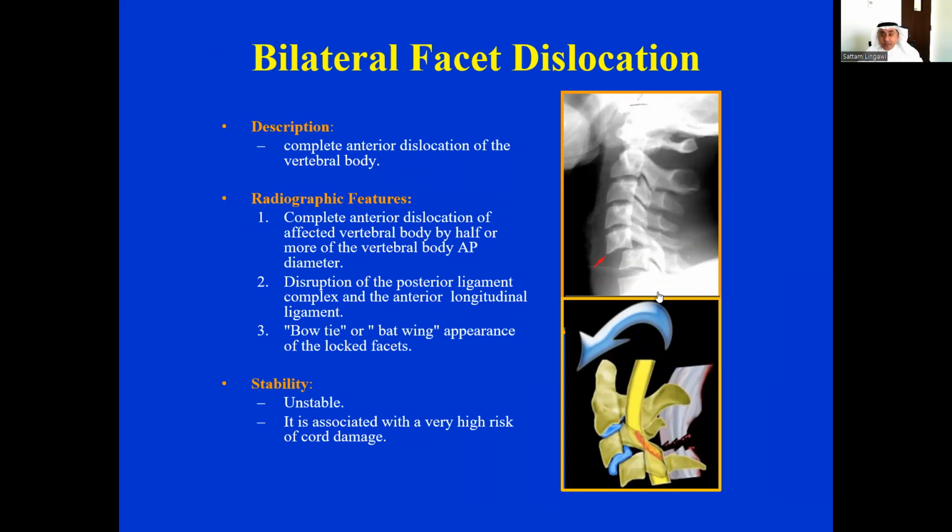With severe compromise to the spinal canal, you may imagine the spinal cord is running this way, then suddenly has to go this way and up. Complete compression and not uncommonly complete transection of the spinal cord at this level. This may be associated with fractures or maybe purely on the basis of soft tissue injury with complete disruption of the intervertebral disc and the interspinous ligaments.